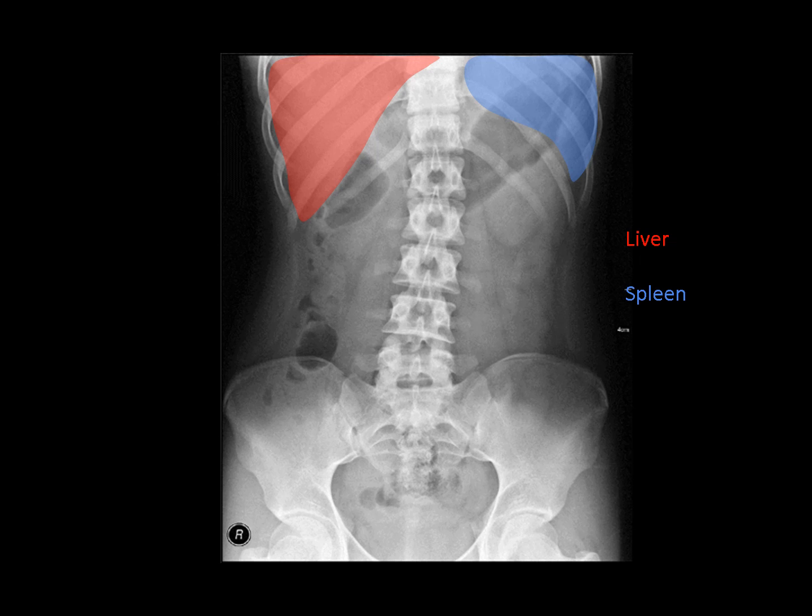If we look on both sides, particularly on the left side of the patient, we can see this outline here, and that forms the kidney outline. On the right side in this patient, it's a little bit harder to see. You can definitely see the inferior aspect here, and then we're losing it as we move more upwards into the right upper quadrant.